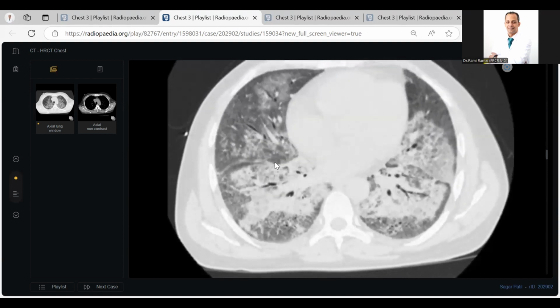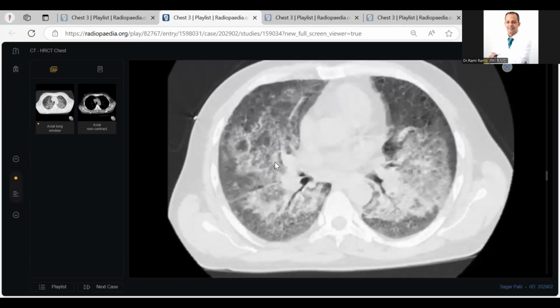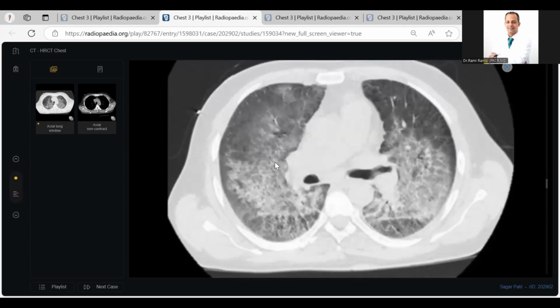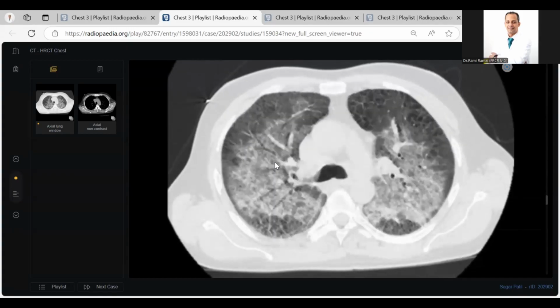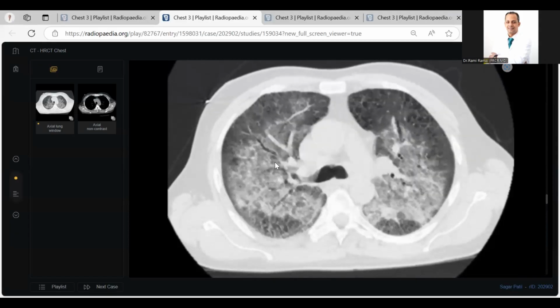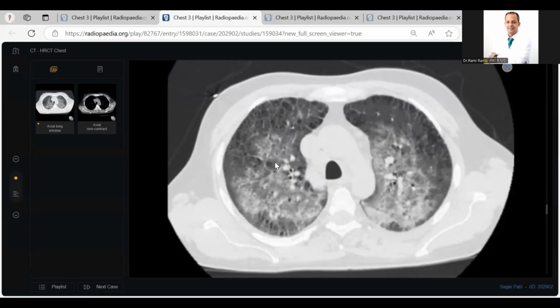See my candidate, my colleagues. This is a classic case of PCP, Pneumocystis pneumonia, with bilateral ground glass appearance intermingled with cystic changes. I will ask the patient if he is immunocompromised. I will ask about AIDS, chemotherapy, other causes of immunocompromise. I will transfer to the AIDS or immunology and pulmonology MDT for prophylactic treatment.